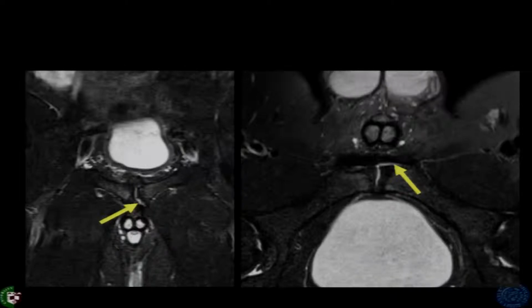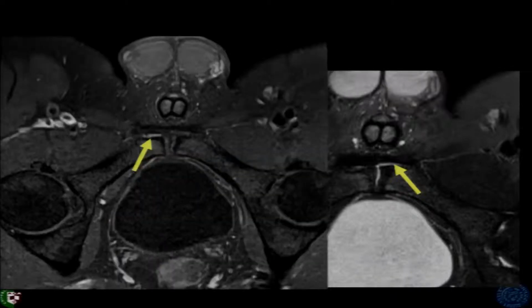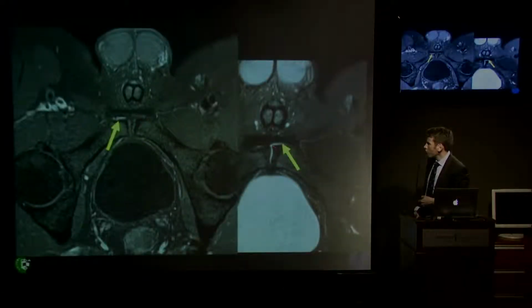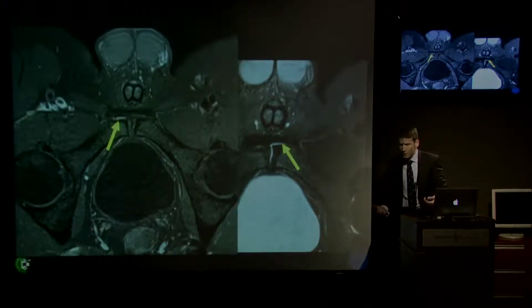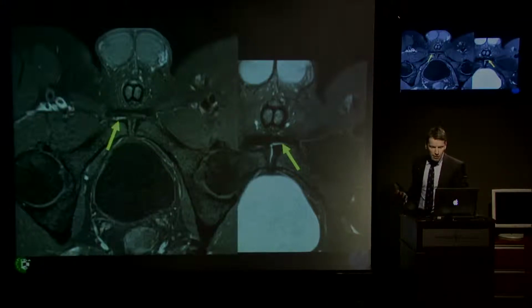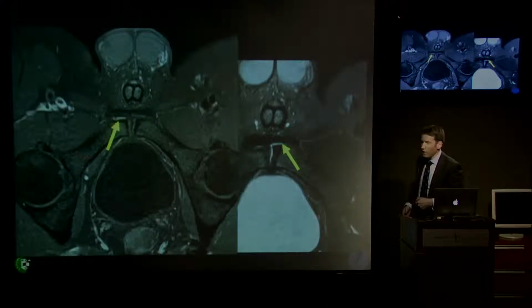But this patient had gadolinium, and lo and behold, look, that area doesn't enhance, and the tissues around it don't enhance, but this area here, with a slight bit of edema in hindsight at this junction of the bone, and this player had right-sided symptoms. So why is that the case? Well, I don't know. I mean, is it the pathological process has produced granulation tissue that isn't edematous, but it enhances because it has vascularity? Probably, that's probably what it is. But it's probably more of academic interest than a really clinical practical issue with what we do.